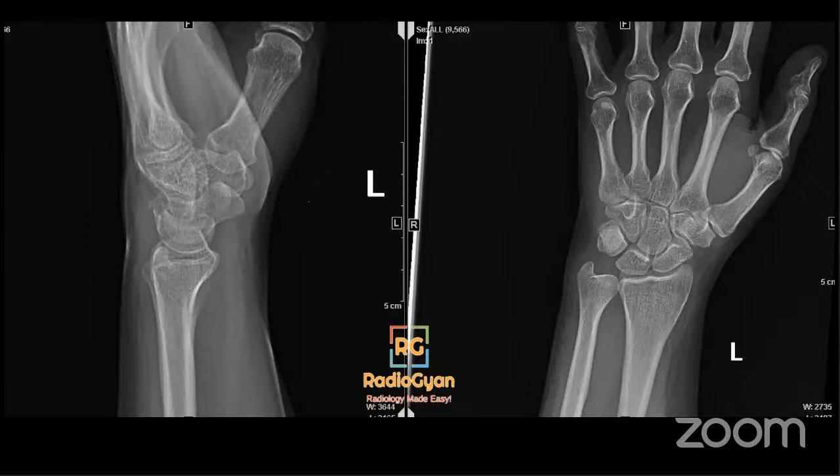The finding may be difficult to see on small mobile screens. So if you have a difficulty, I'll point out the abnormality. So I'll give you a couple of minutes. So the most common thing you have to look out for are distal radius fractures. We don't see a lot going on the frontal projection, but there's something on the lateral projection. I'll point it out, and maybe it'll be more clear then. So what do you think is happening here?